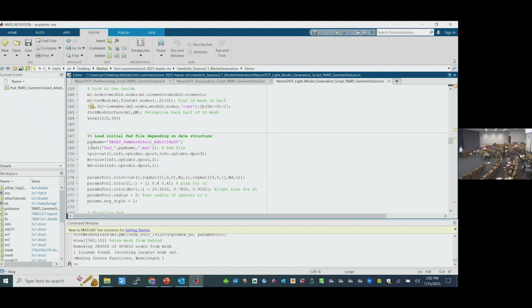Okay, dumb question. We don't have MRI data, so we're going to be using atlases. Where do we find those? So in NeuroDOT, we contain a bunch of atlases and segmented volumes. We have the MNI 111, or 1 millimeter, segmented volume, which is what a majority of our light modeling tutorials use. You can go in the toolbox for that. You could also search online for other ones.